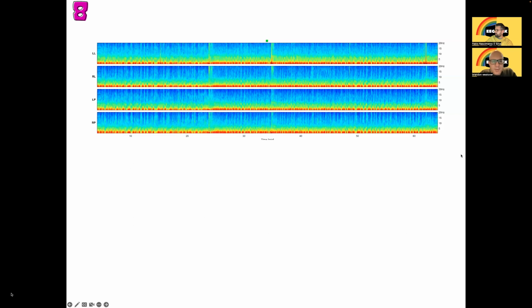Okay. All right, let's see another one. What's the pattern here? So it's narrow, it's everywhere. But it's kind of choppy too at the same time, right? A little bit. There's some waxing and waning of whatever it is. So could it be just generalized? We'll say the pattern first. So it's narrow band. It's kind of monotonous, I think. So GRDA or generalized irregular slowing?